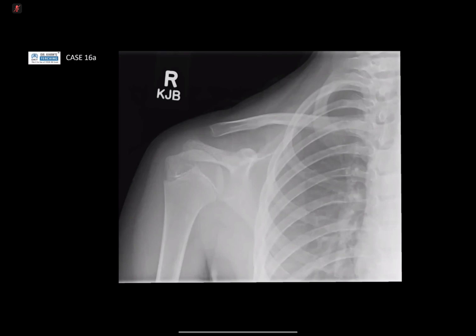Do you want to ask me? You can also see the right acromioclavicular joint, there is widening. Okay, so what if I tell you that you can feel a palpable lump or pain at the medial clavicle on the right? Okay, I might see an expansion at the medial aspect of the clavicle, however, no cortical disruption or periosteal reaction.